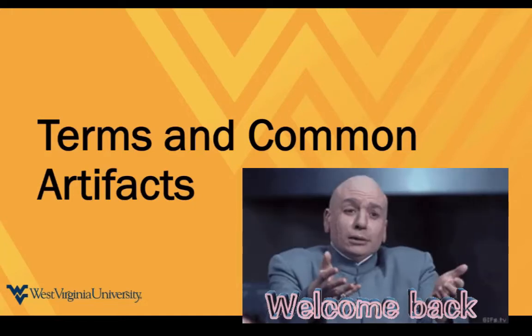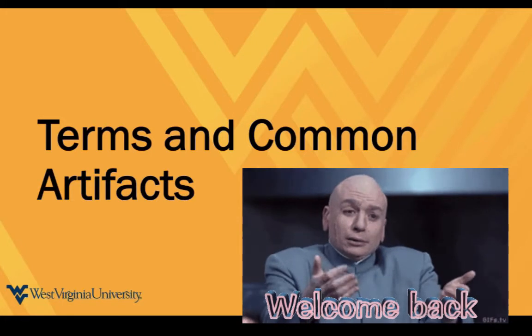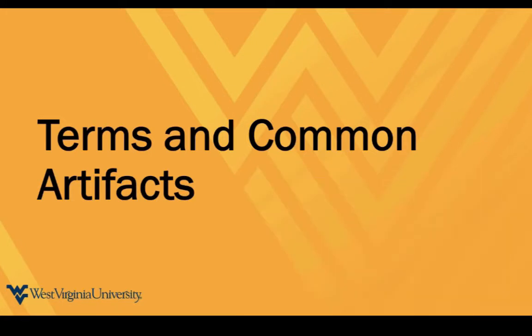Hello and welcome back for part 2 of our introduction to point-of-care ultrasound, where today we're going to go over the thrilling sequel and talk a little bit about some of the common terms and artifacts that you might see, just so you can start recognizing what images look like. We're going to talk about how to acquire images and how to think through that, and how what your hand does affects what you're going to see on the screen.